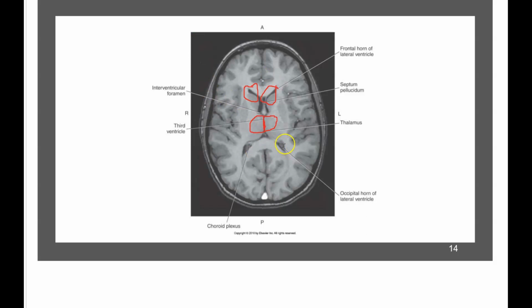So this little doodad right in the middle, so this little guy right there, that is your choroid plexus. So right here. So this makes your CSF right there. Okay, so you see that little guy right in there? That is your choroid plexus.